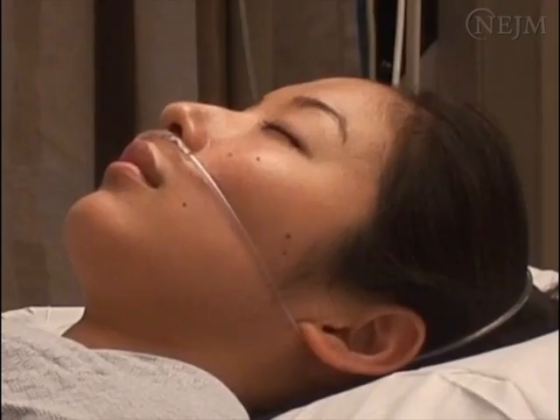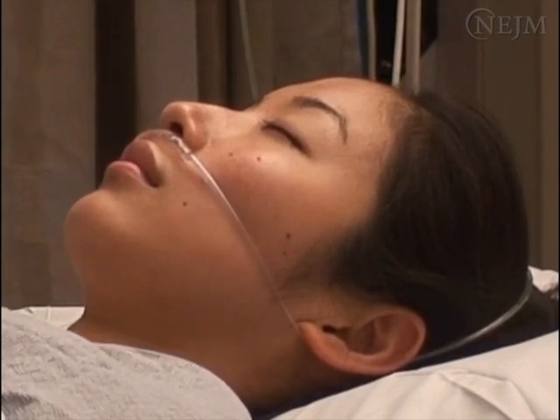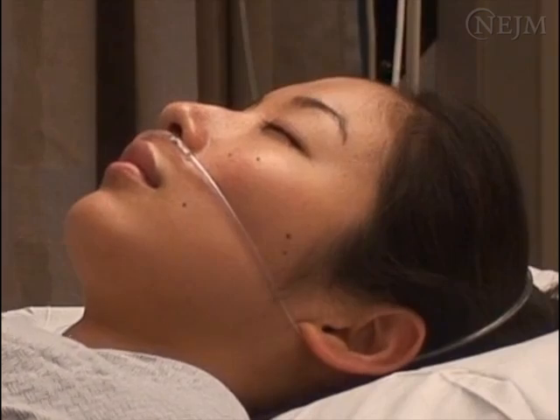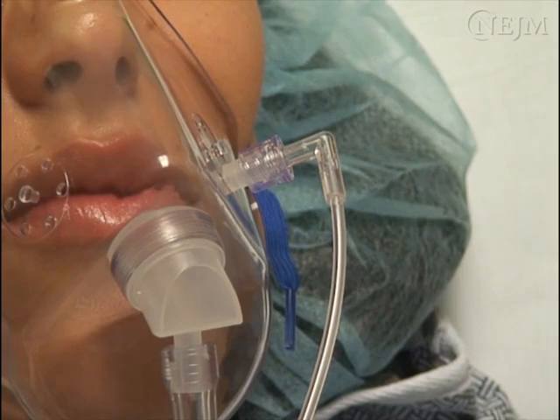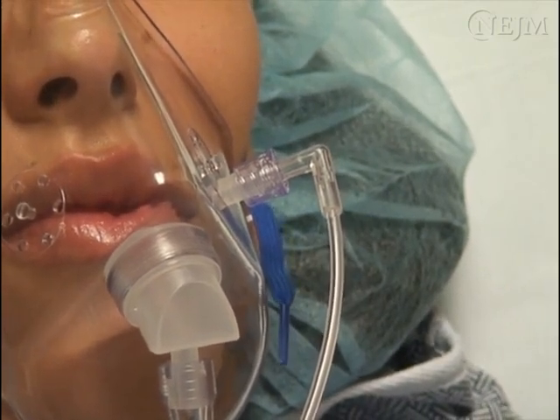However, in patients who are not intubated, side-stream capnographs can be used conveniently with a face mask or nasal cannula to monitor respiration. Nasal cannulas and face masks that feature integrated CO2 sampling are commercially available.